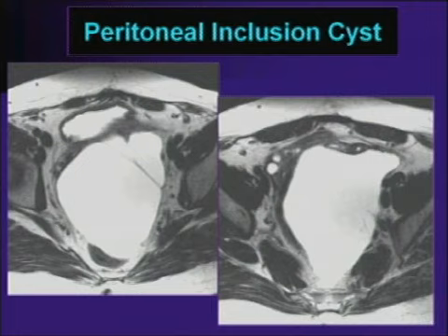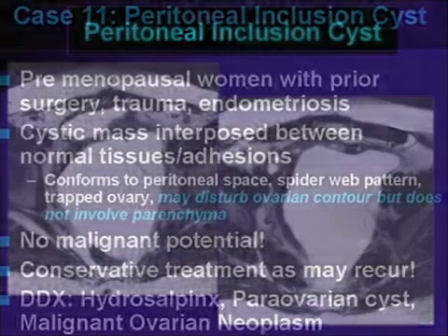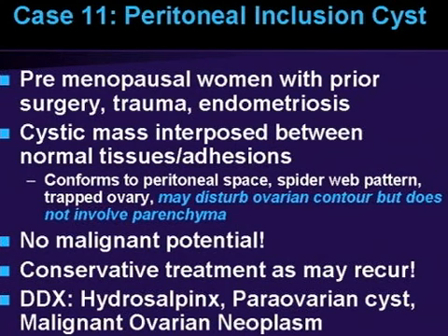It's patients who are still hormonally active, and it's usually due to fluid accumulation in these cases. And normal physiologic activity of the ovary may lead to the development of these large cystic masses. They tend to cross midline, and again, they don't exhibit a lot of mass effect in that they just conform to the confines of the pelvis and push organs away.